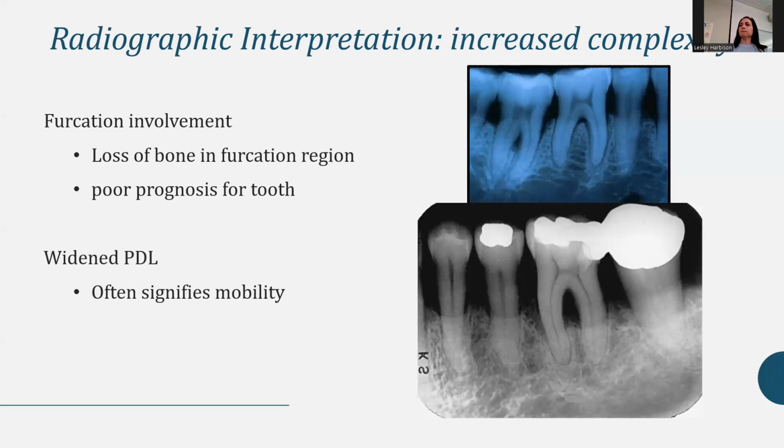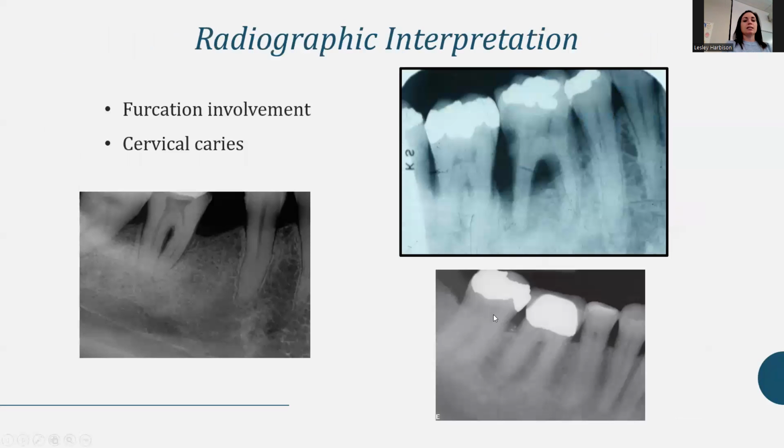Would you label that as positive furcation? It's hard to tell until you get in there, but if you are just barely feeling a dip, it's class 1. And if you feel like you're getting into it at all, then it's class 2. I think it's harder to say on a radiograph, but sometimes, like this one, you're like, well, that's through and through. My goodness, if that's not through and through, I don't know what is, but it's a little harder to say furcation classes just by radiographs.